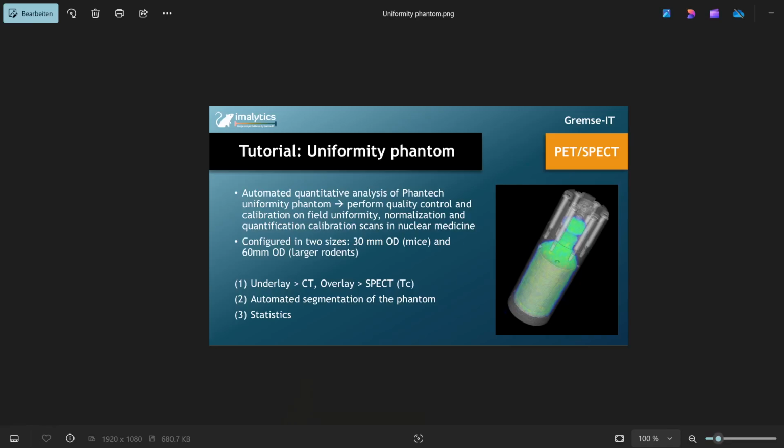Hello, welcome to this tutorial video where I'll be walking you through the automatic analysis workflow for Phantech Uniformity phantoms using the Imalytics Preclinical software.